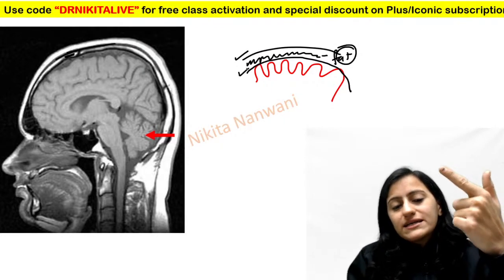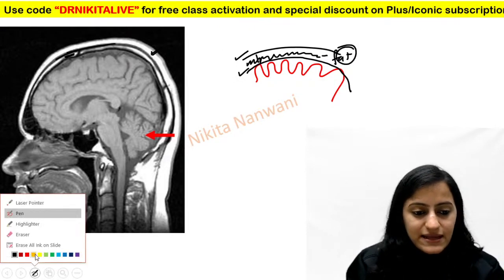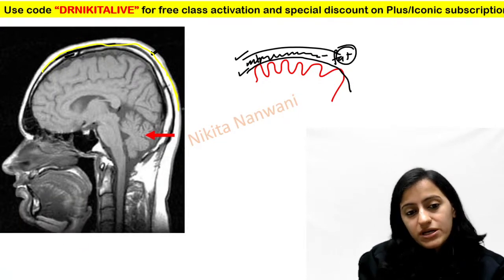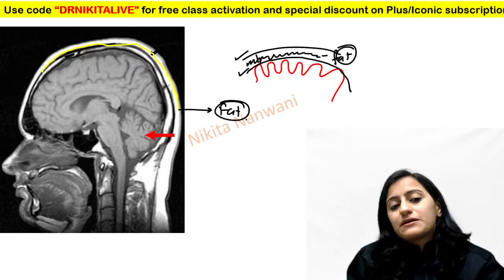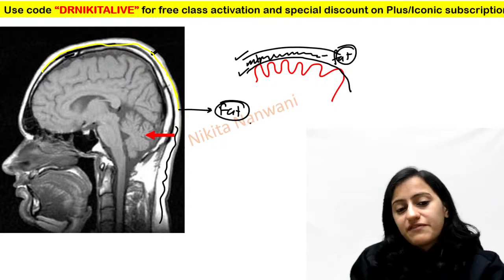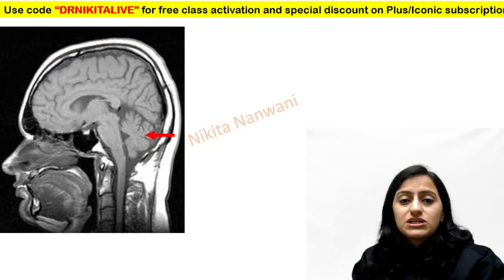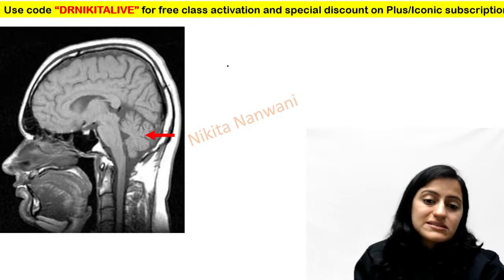So this is the outer cortex, this is the inner cortex, this is the bone marrow, and outside that is the white line that you see, which might make you think this could be CT. Remember, this white line is not the bone. This white line is the fat. It's the subcutaneous fat in the scalp which is appearing white. So please remember, all of you, that this is MRI, because you can be asked a question like identify the investigation and the labeled part. So you need to know whether this is CT or MR.